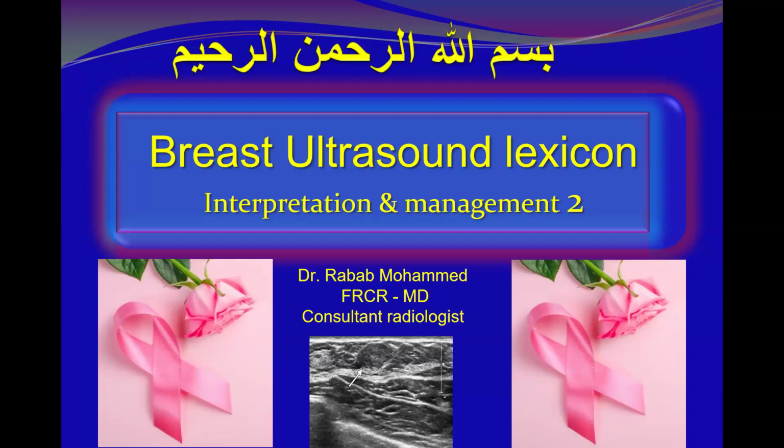Hi, today I'd like to continue highlighting the descriptors and lesion characterization. Previously, we have discussed the breast mass descriptors: shape, margins, orientation, echo pattern, and posterior features.